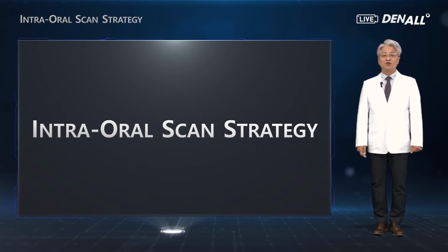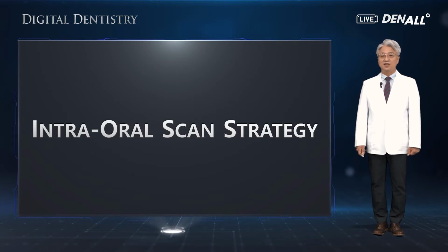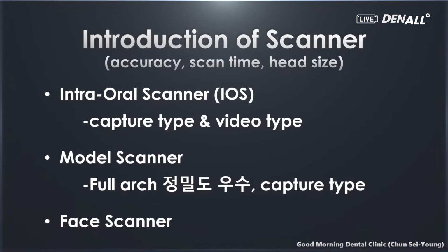When it comes to digital dentistry, I'm going to talk about how to accurately do the oral scanning and how we can utilize the precise scan data in our clinical setting. First, let me introduce the scanners.